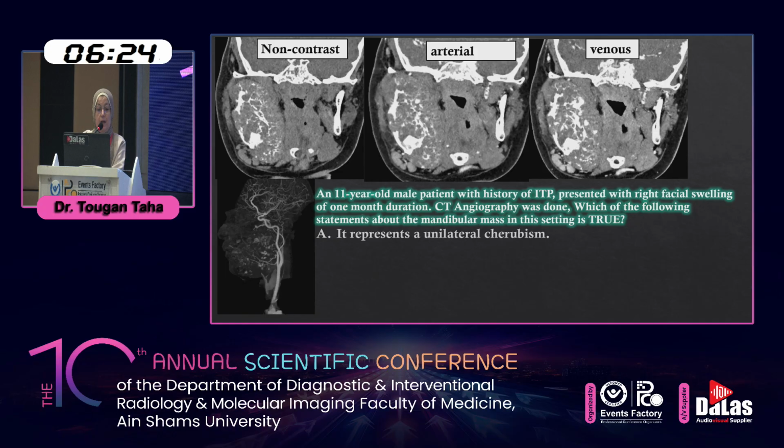My last case is an 11-year-old male patient with a history of ITP, idiopathic thrombocytopenic purpura, who presented with right facial swelling of 1 month's duration. CT angiography was done. Which of the following statements about the mandibular mass in this setting is true? It represents a unilateral cherubism.